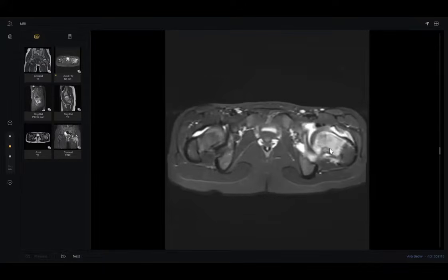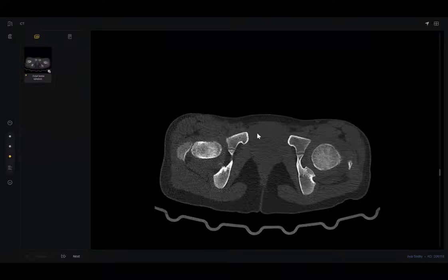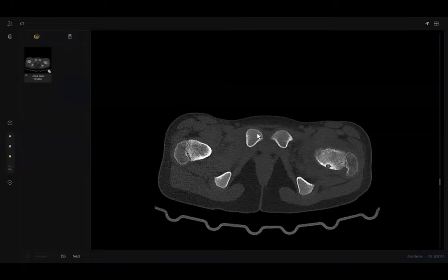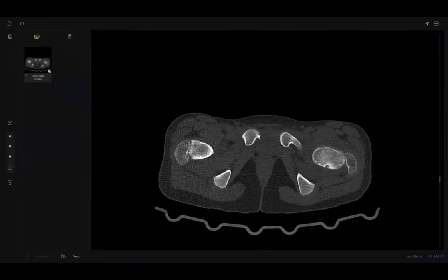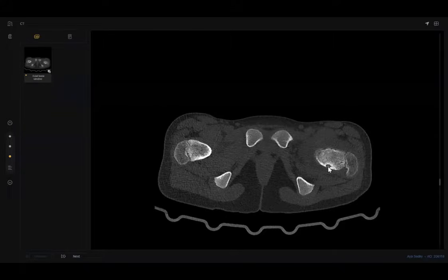Look here, this is the intracortical lesion, this one. So you ask for CT. In pediatric patients or children, the only allowed CT indication is if you are in doubt about osteoid osteoma. Osteoid osteoma has a lucent nidus with central calcification, plus it is surrounded by sclerotic reaction.